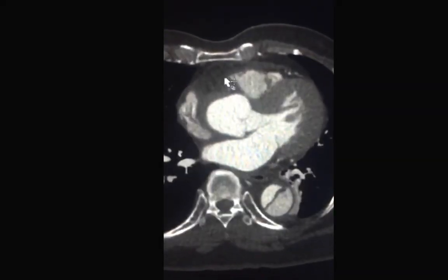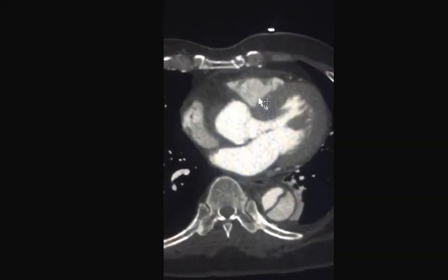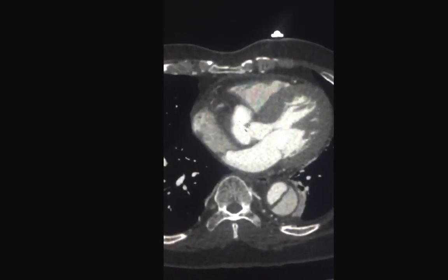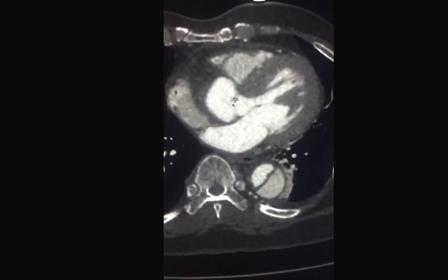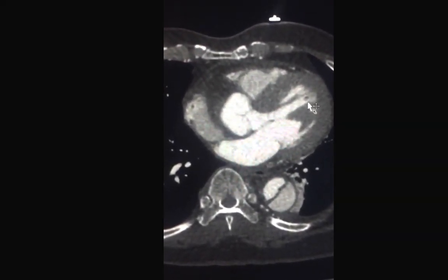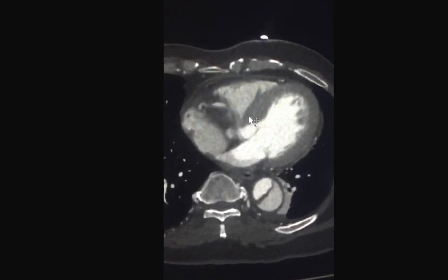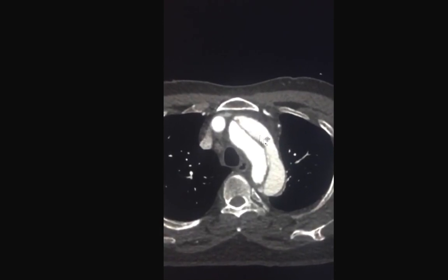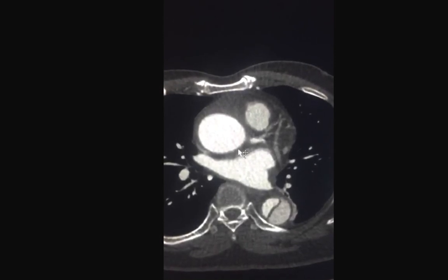If such a pericardial abnormality compresses or restricts the cardiac function, this is what we call tamponade, and this may be fatal. An additional complication is extension into the aortic valve. These are the aortic valve leaflets. If they are involved, you may have aortic regurgitation. And severe aortic regurgitation would affect the left ventricle in a way that could lead to heart failure, and that may be associated with high morbidity and mortality. Finally, an aortic dissection that extends into the pericardium may give the patient fatal arrhythmias. So due to stroke, MI, arrhythmias, tamponade, acute aortic insufficiency, this is an emergency that needs to be treated now.